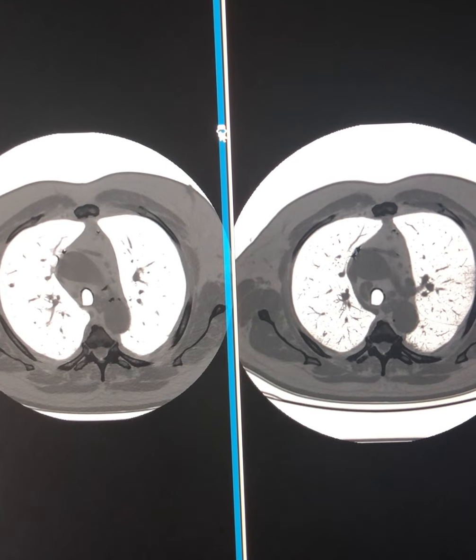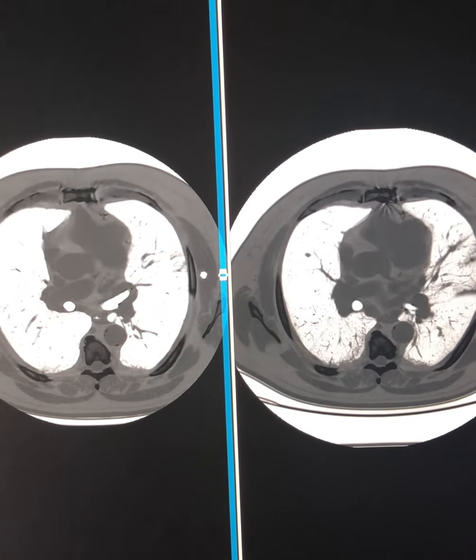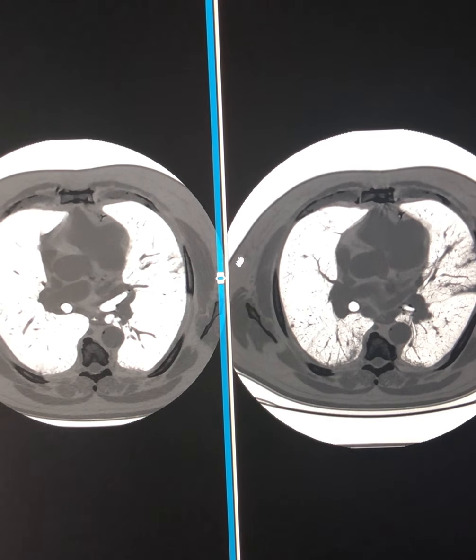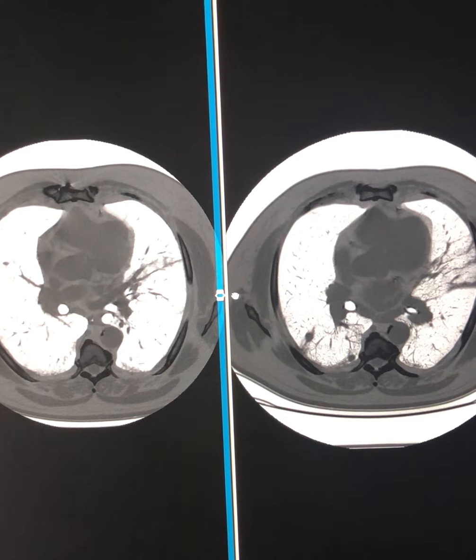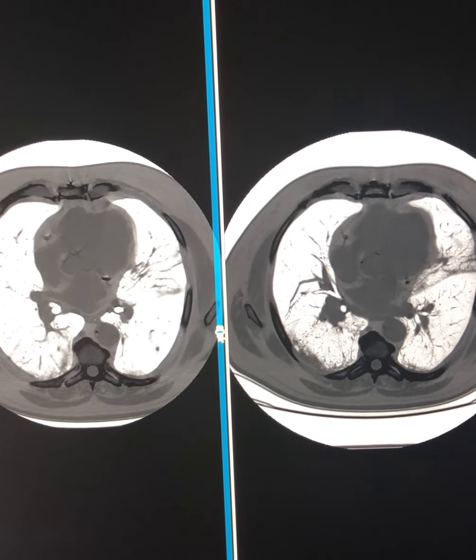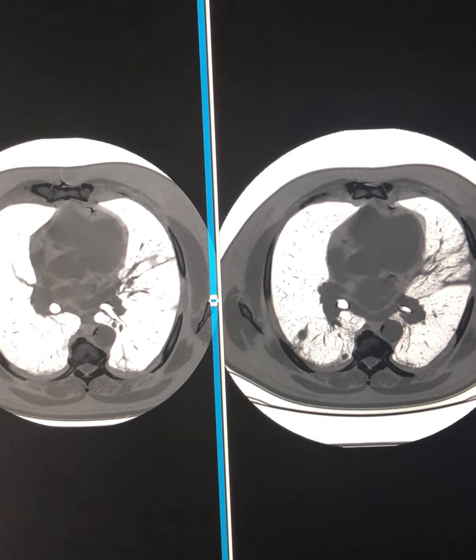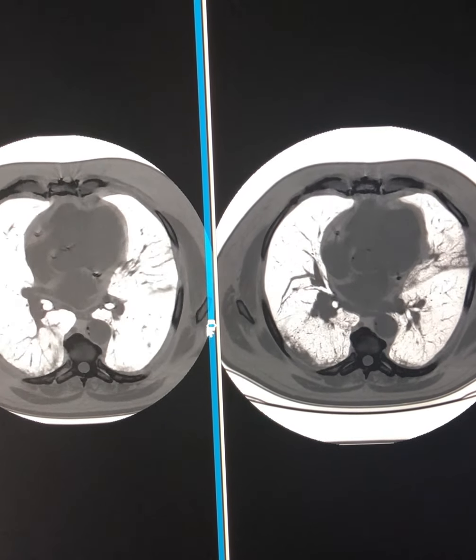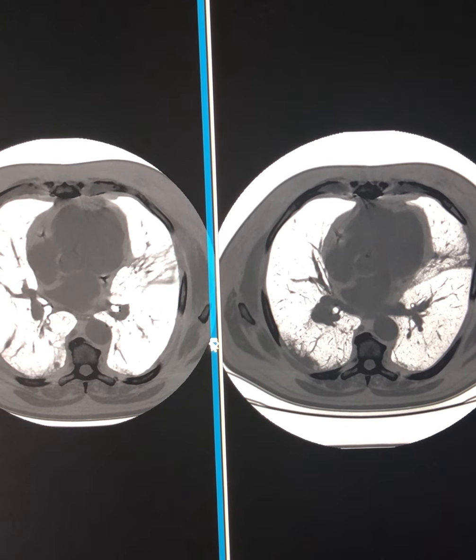But when we go further inferiorly, you have greater movement, and you can see on the next nodule, which is here, you have to go several slices before you catch it on the next scan. It becomes even worse as you go even further down, and you can see that this nodule here is invisible at exactly the same vertebral level, and you have to go many vertebrae below before it comes into view. It's important to bear this in mind when interpreting CT scans.